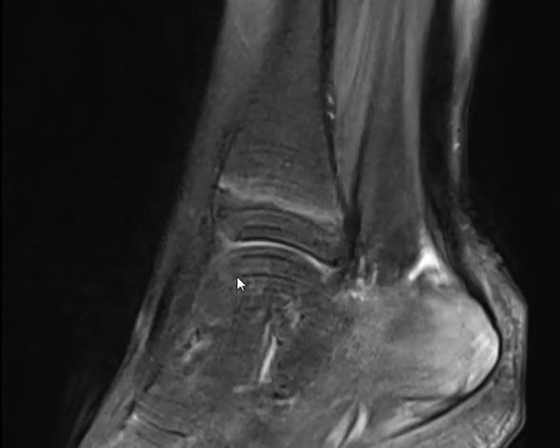T2 sagittal. Exactly. To be precise, to be properly scientific, it's proton density. There are three: T1, T2, and proton density. In the musculoskeletal we don't use T2, we use proton density. When we talk we say this is T2 fat sat, but it's not T2 fat sat, it's proton density. It's usually proton density.